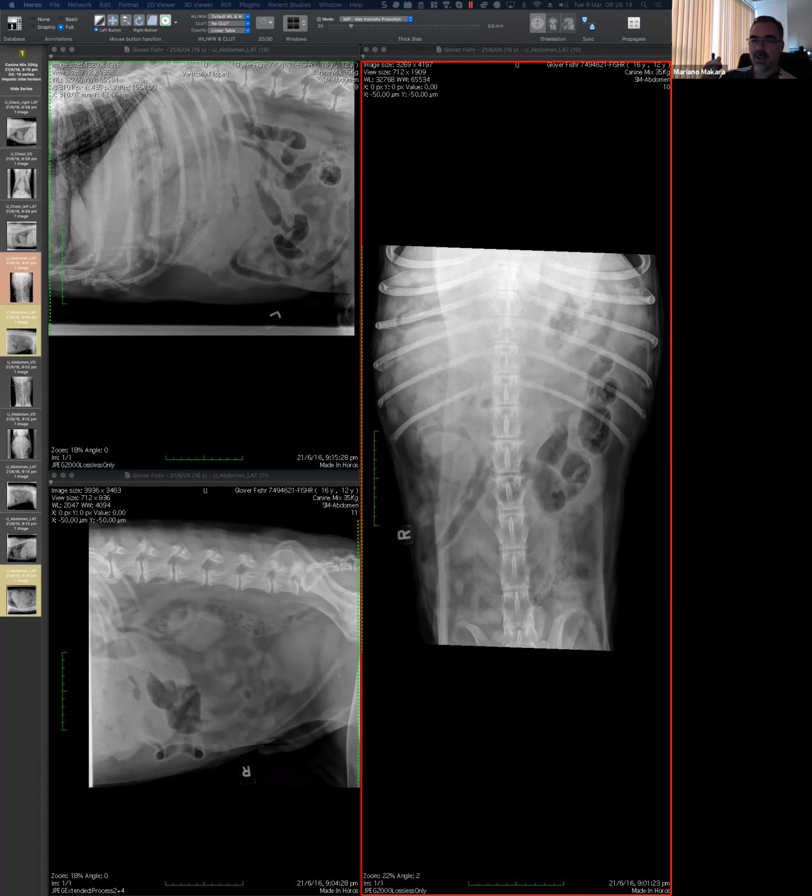Makes sense? Because then we are going to go through the things that can result in production of gas in the abdomen. But what I would be desperate to try to figure out in this case is, in the same way that I was suspecting free fluid here, is there any free gas? Makes sense? I think that's a very important point that you may not be able to answer right away, but you should be concerned. Makes sense? Because then we are dealing with a disease process that is producing gas, and probably it's not only that, but it broke into the peritoneum. So the question is, do you see any evidence of free gas?